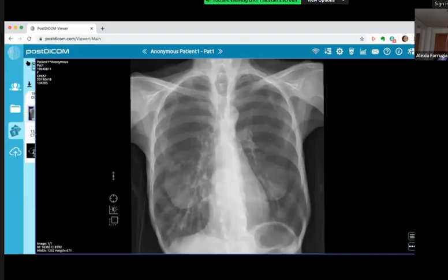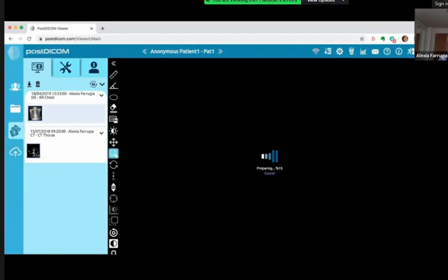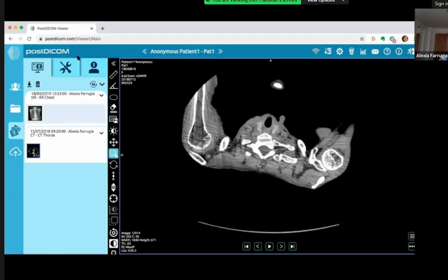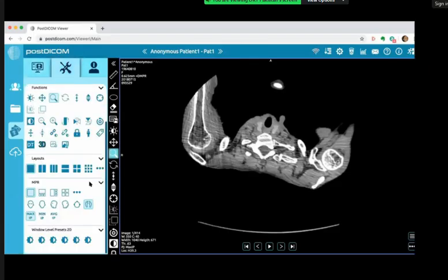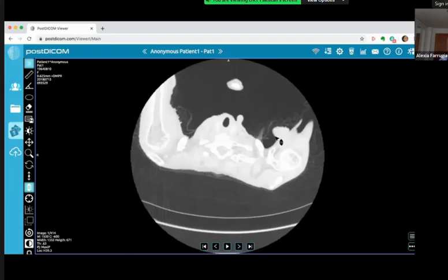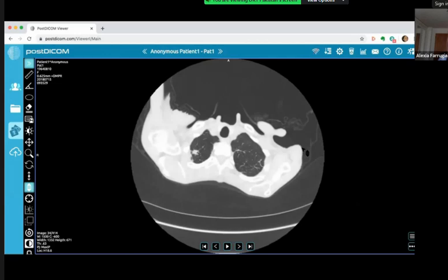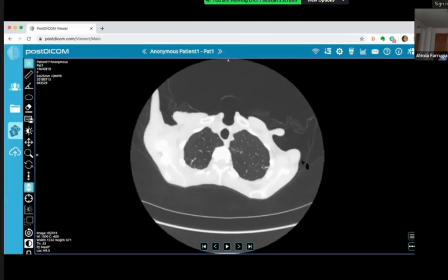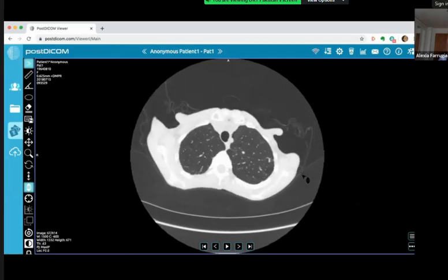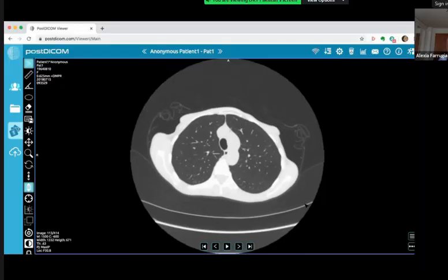So we did a CT for her. And if you focus on the lungs, just change the window for you. Have a look. So the chest X-ray wasn't really indicative of anything specific, was it?